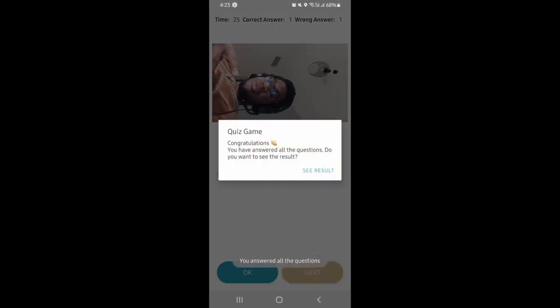Next, as you can see, because we only made two activities for the day, we only prompted two questions. But the more activities we make, the more questions we get, and there's a limit to it, so we do not have an infinite flow of questions. So just to ensure that the user can recall events that have happened over a period of time.